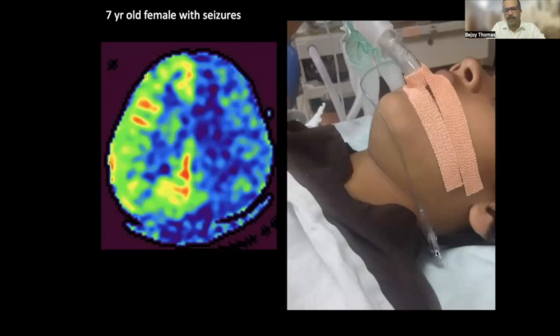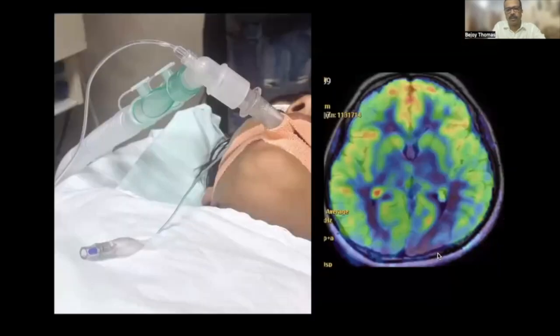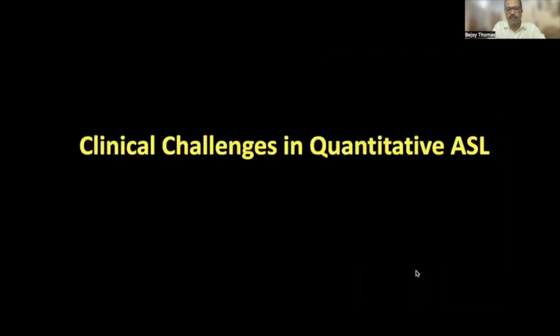But even then, this metallic spring can produce artifact. The labeling is a very sensitive process, and the metallic spring in this pilot tube on one side can produce poor labeling. This is what happens after we tape the pilot tube to the central part. You can see there is much improvement in perfusion.